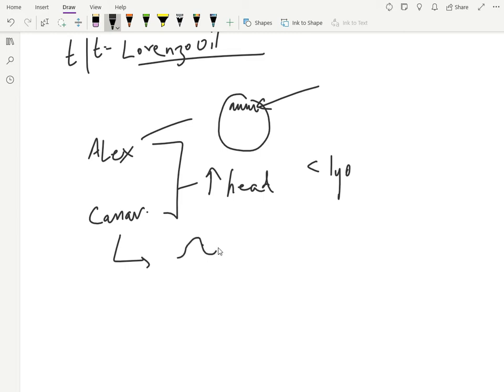Now we talked about the U fibers. U fibers are just beneath the cortical mantle. You have involvement of these white matter areas. This is the gray matter and this is the white matter. So you have involvement of these U fibers. Now this was not seen in metachromatic leukodystrophy, but this is seen in Canavan disease.